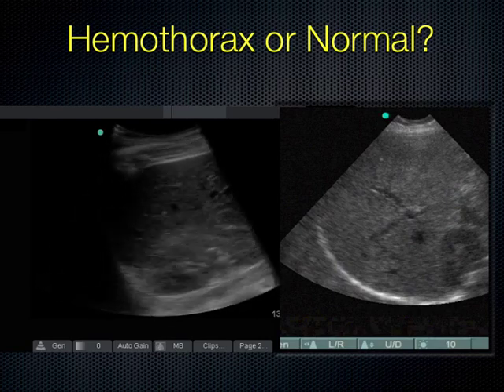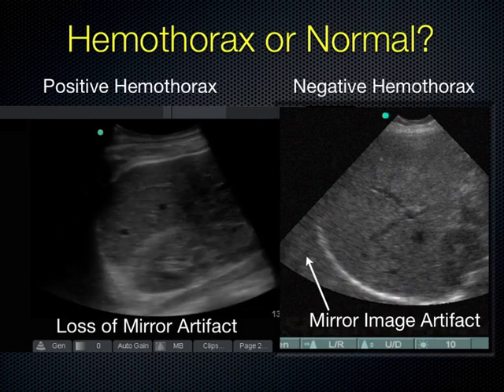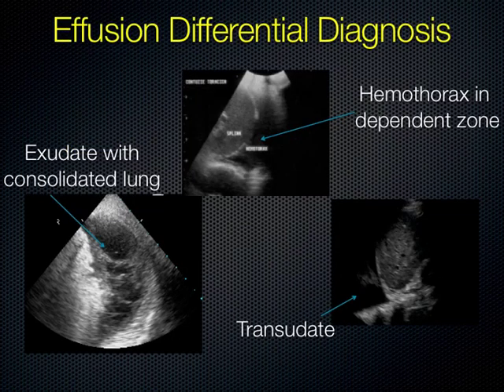I've mentioned transudative versus exudative effusion in hemothorax. Sometimes you can tell the nature of the effusion, and it guides your management. For instance, if you're thinking about just putting a very thin needle into an effusion to drain it in a thoracentesis, you might not choose to do that if you have something that looks very thick with fibrinous loculations or blood in it, because you need to manage those differently. So it does help. It's not diagnostic. You should never say this is transudate versus exudate based on what the ultrasound looks like, because you need to send it to the lab to be sure, but you can pretty much tell when you look at it if you're going to need a needle or a chest tube to drain it. So it's very helpful for that.